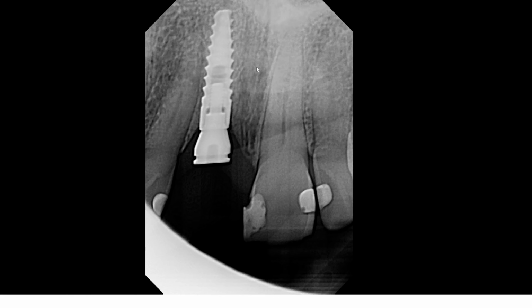But again, I really don't know the exact spatial relationship, because it is possible that you'd still be able to place an implant more centrally within the ridge if that implant is buccally positioned relative to the nasopalatine canal. So that's still possible.